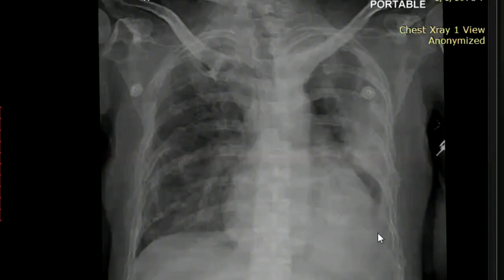But for mesothelioma, you can keep it in the differential, but I would say lower down, because the lung volume is still preserved. There is a tilt and it is a portable film, but like in the previous case, the lung volume was significantly reduced and the trachea was also shifted towards the side of volume loss. So fine, but diffuse osteopenia, multiple lytic lesions, right? Yes.